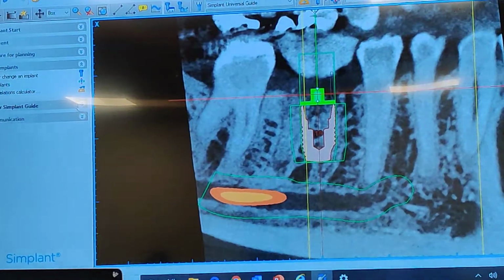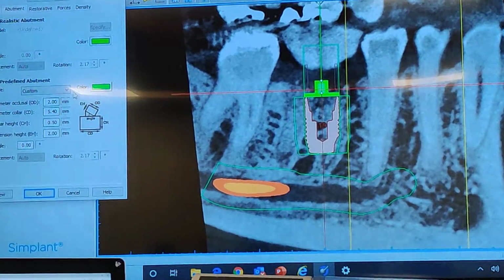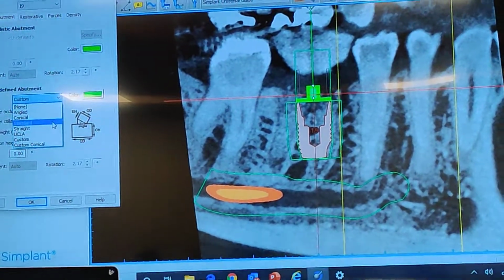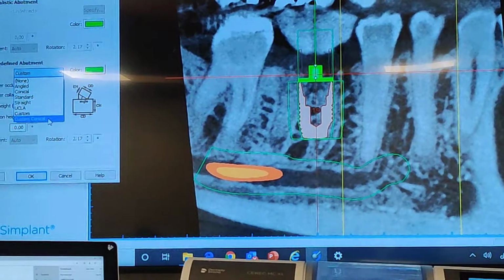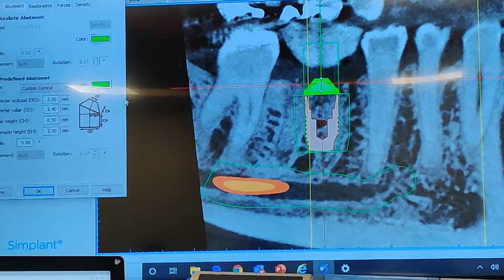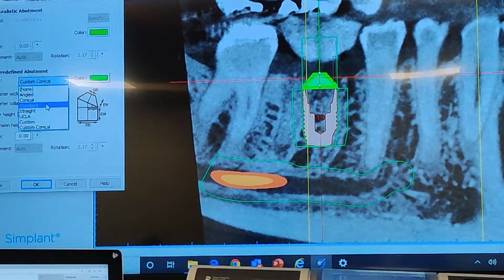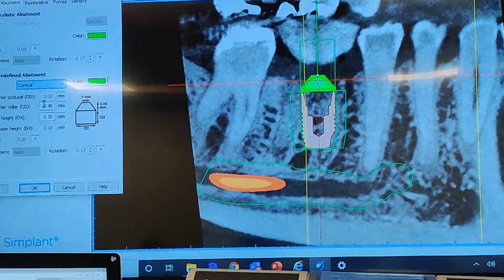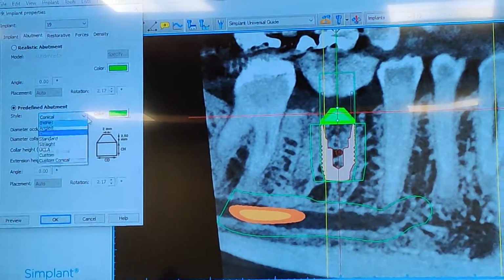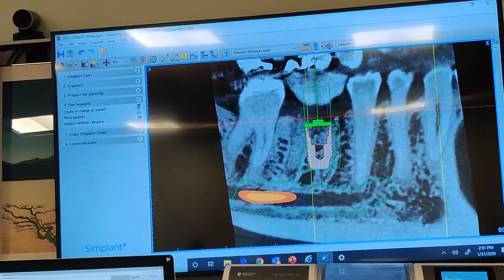But that's not right. Hold on. Standard. Okay, well, I can figure that out.